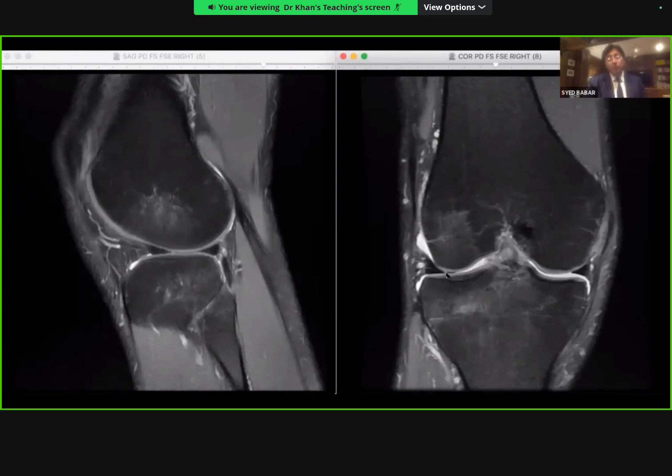That's again another pointer that there's something going on, which is multi-ligamentous, a sort of twisting mechanism injury. Okay, so we've already confirmed one finding. We're already suspicious of an ACL tear, and we keep moving centrally.